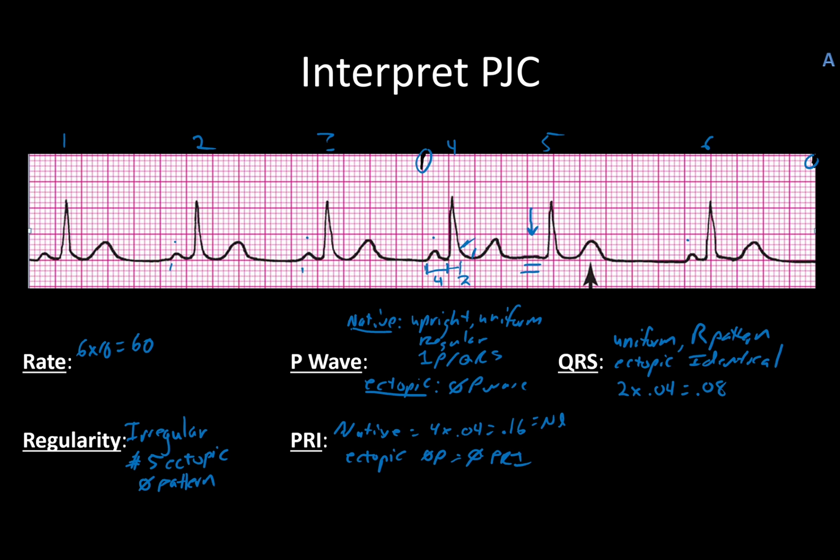But what I will say is this: if you look at beat number 1, you can see how there's a really sharp demarcation between it. So if I started here, this is where my R wave definitely ends at this location. And then it kind of slopes down after that. The angle has changed. That's the J point. And so I use that to determine where it ends. That's the reason why I went with that. If you check a different one, like over here on number 6, you can see it a lot clearer as well, from about here to here. And again, that's about 2 small boxes.